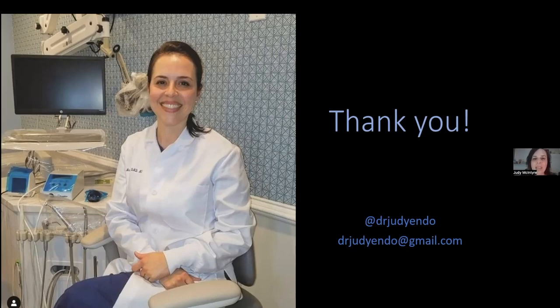What I recommend is that anytime you're going to change a restoration, take one within a month or two of replacing that restoration. There might be a lucency there. A lot can change in 5 years on that tooth, right?